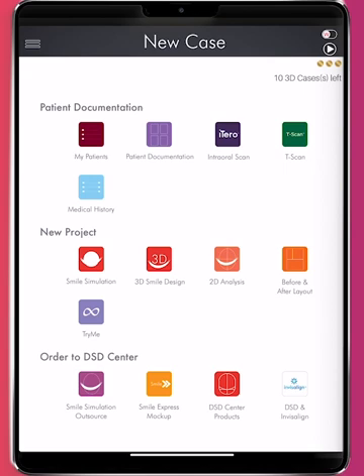Then we have the new project section. You can create a smile simulation, 3D smile design, mock-up, 2D analysis, before and after layout. With the Try Me option, you can practice all the features in the app. We have 4 cases 2D, 3 cases 3D. All these cases are with our patients, with our pictures, with our STLs, so you can practice.